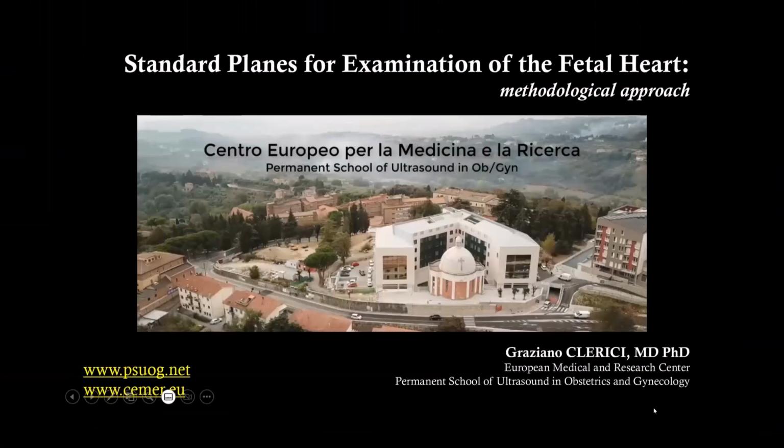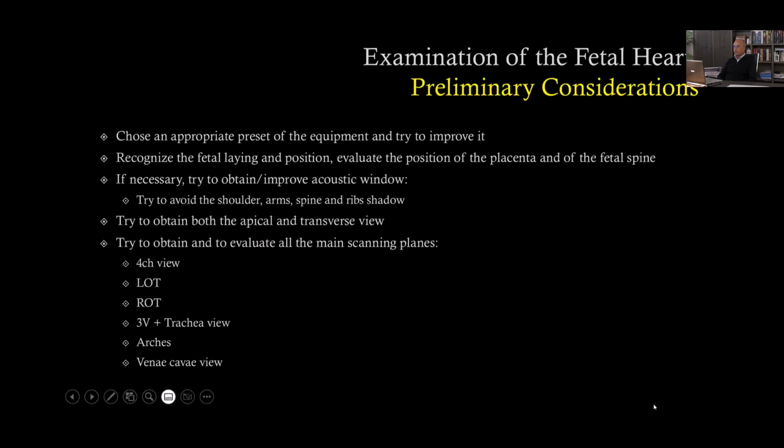And now I will start my presentation by focusing on the methodological aspect of how to obtain the main scanning planes for the evaluation of the fetal heart. So before starting the examination of the fetal heart, I want to share with you some preliminary considerations. Particularly, I suggest, before starting the evaluation of the fetal heart, to choose an appropriate preset of the equipment and try to improve it when you are confident with the machine.